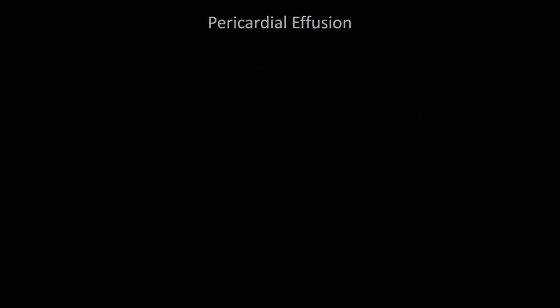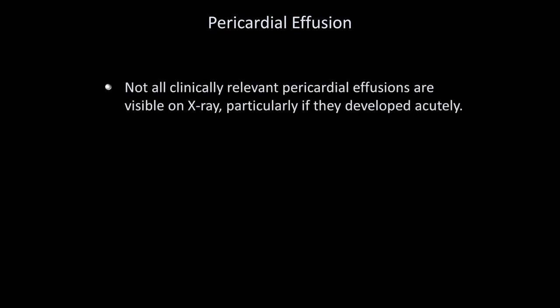Moving on to pericardial effusions, not all clinically relevant effusions are visible in X-ray, particularly if they developed acutely. That's because pericardial tamponade, a condition where diastolic cardiac filling is impaired due to high intrapericardial pressure, is dependent on both the volume of fluid within the pericardium as well as the speed with which the fluid accumulated.